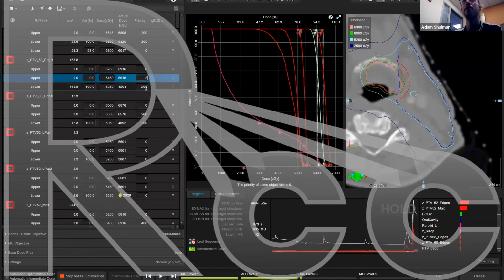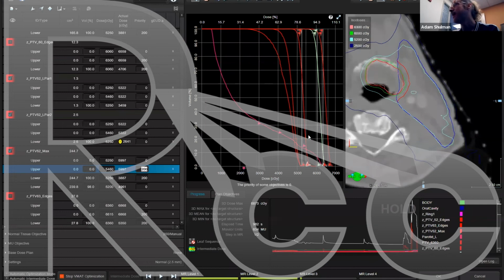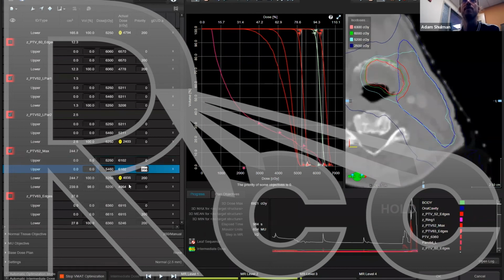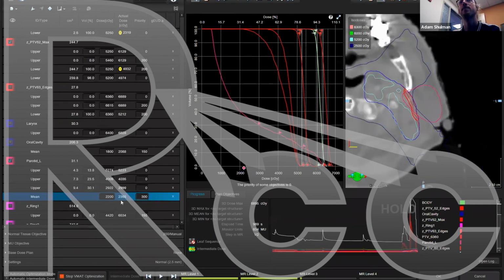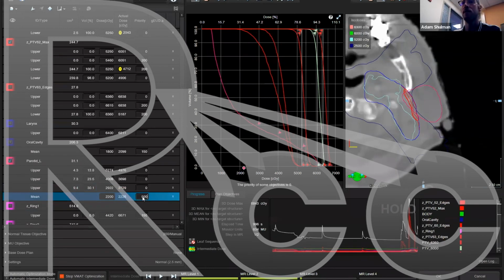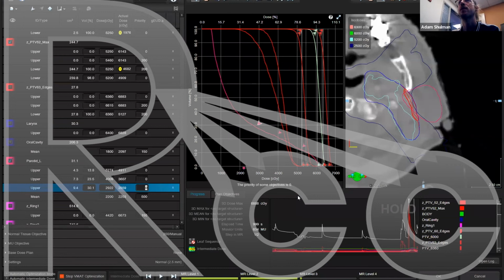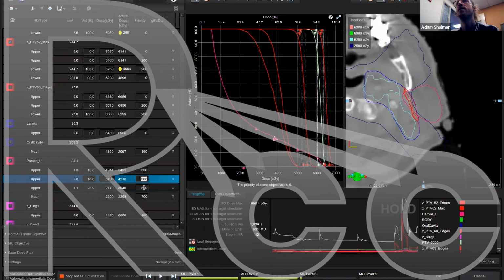I'll show you one other thing. It's a helpful tool. So I'm going to do something I'm not supposed to do, but I'm just doing it for teaching purposes only. So I'm going to bring this parotid way down. So don't do this. This is just for teaching purposes only. Let's bring it down even further. Okay. You can see in step 3 later on, it doesn't work very well anyway without those fine adjustments. So you can see where the optimizer is struggling in step 3 to make gross adjustments for my parotid.